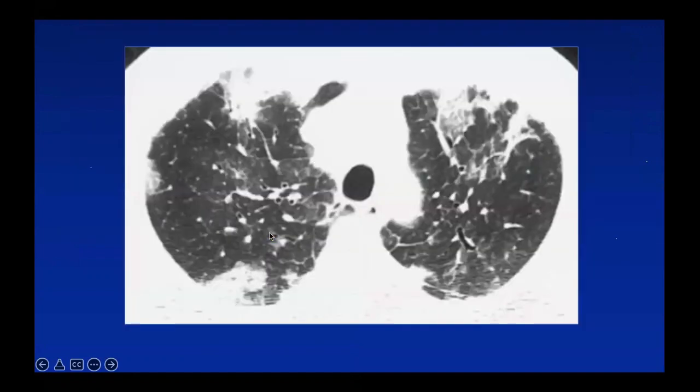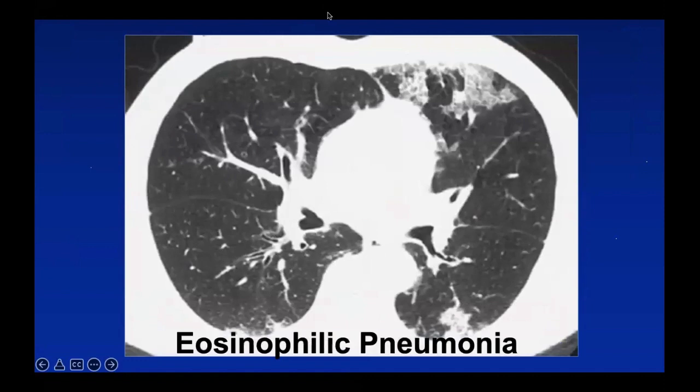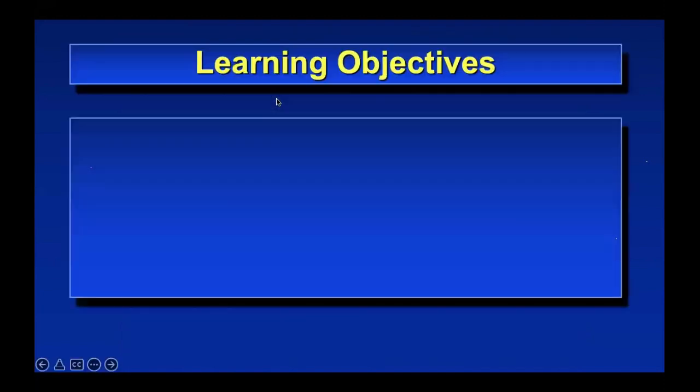So that's what I would say is the most likely diagnosis. This one turns out to be eosinophilic pneumonia. But if I had to say what's most likely, I'd say organizing pneumonia first, eosinophilic pneumonia second. And a clue is, again, peripheral eosinophilia. In other words, in the blood smear, we will see eosinophils.